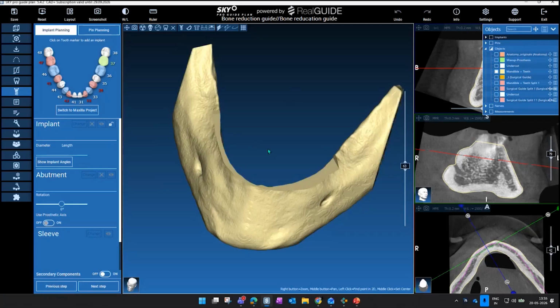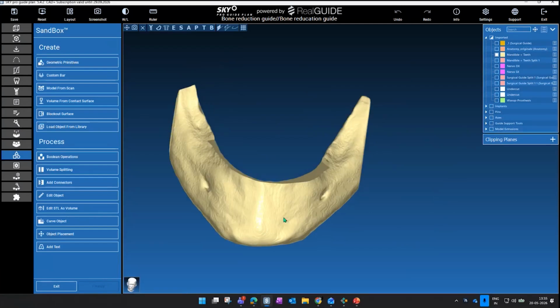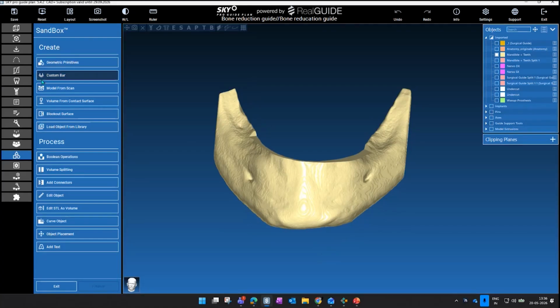Okay. We have crossed all these stages, and if you see this logo which says Sandbox, click on that. I will use this STL file just as a reference. I'm not doing anything on it as such. If you see the first few options, first it says create. This is to create something new, a new STL file, and these tools are used on already existing files also.